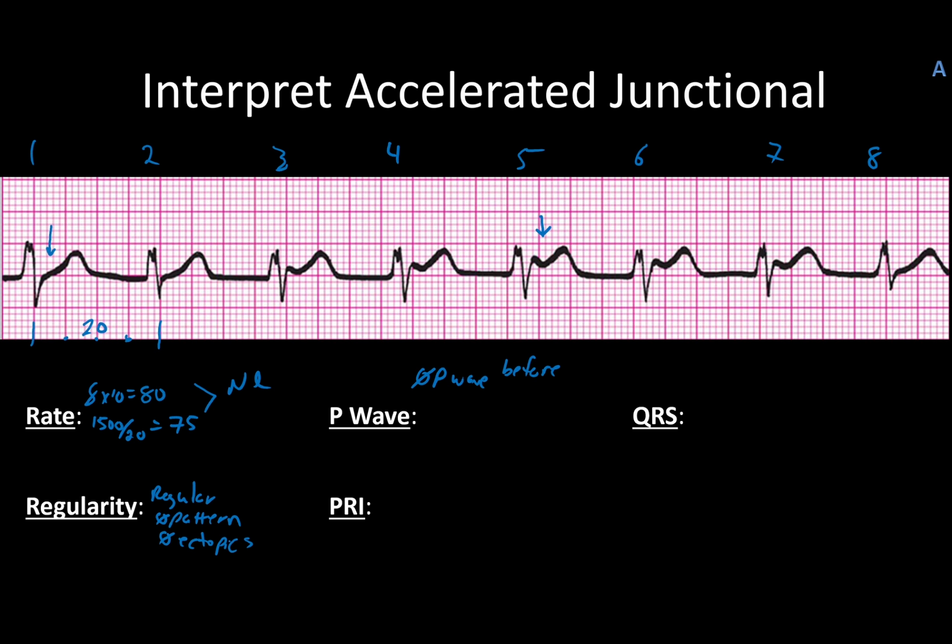The way this works is their energies are canceling each other out. The T wave wants to travel in an upward direction, right? Whereas that P wave is inverted. And so adding those two together creates a bit of a push and pull. So think about it this way, that you've got a T wave that slopes up and it kind of comes down like that.